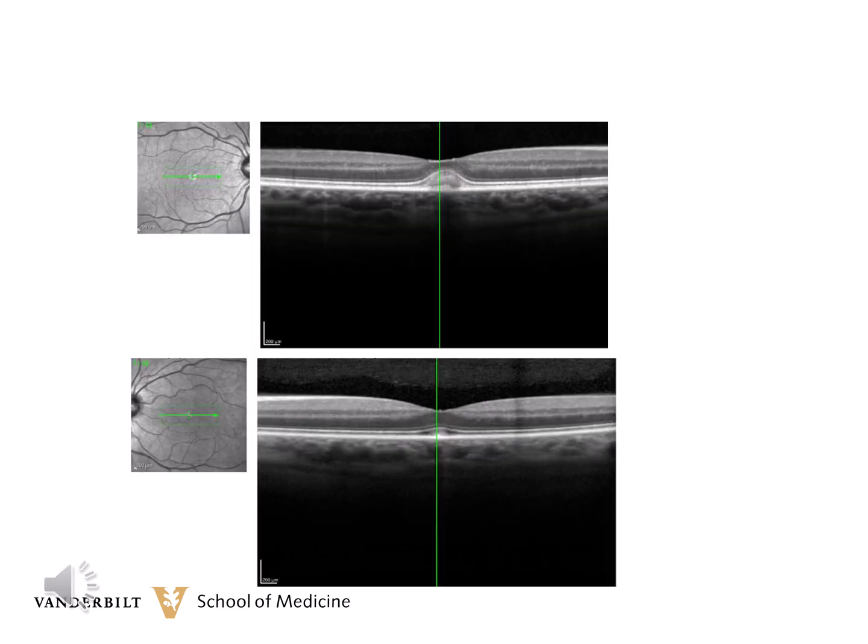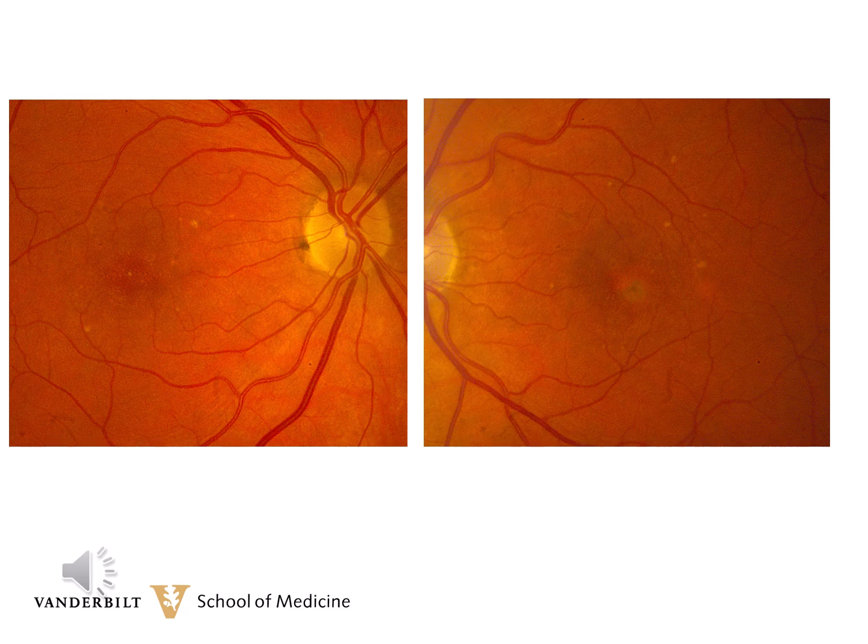And here's her OCT. Again, the right eye shows the typical hyperreflectivity under the fovea. The left eye is just about normal, although there's just a slight hyperreflective band, and you can see that very easily between the ellipsoid zone and the pigment epithelium. One more example of how an OCT can help with the diagnosis.